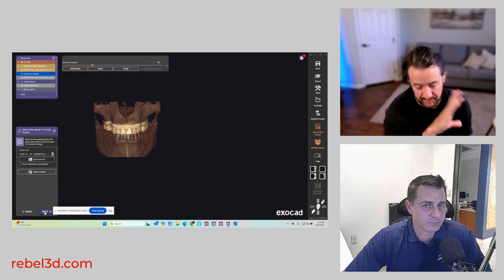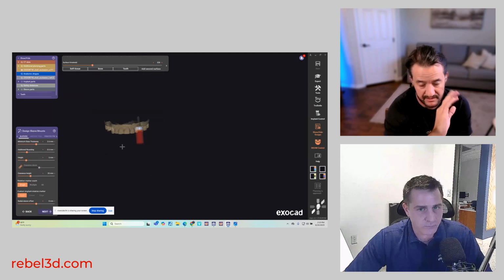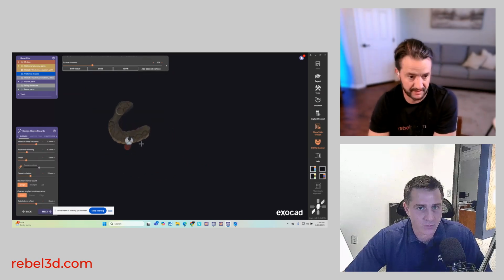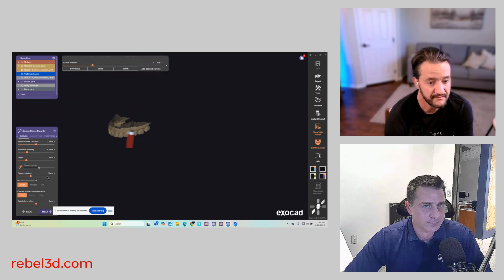Yeah, so if you just wanted to plan, you could plan here and then go freehand once you've made some decisions on size and position of the implant. Right. And if you want a guide, then we'll proceed.